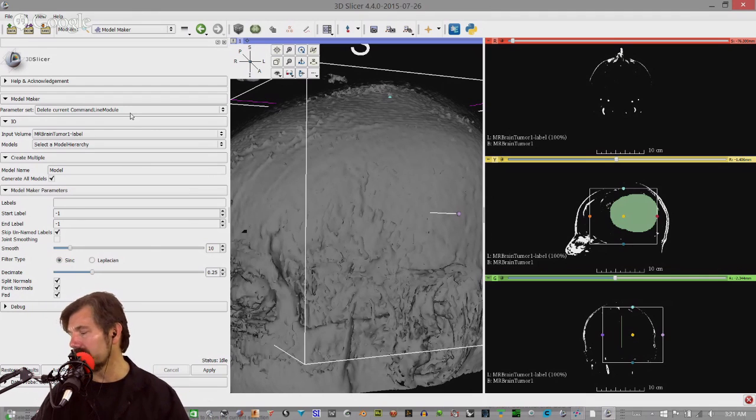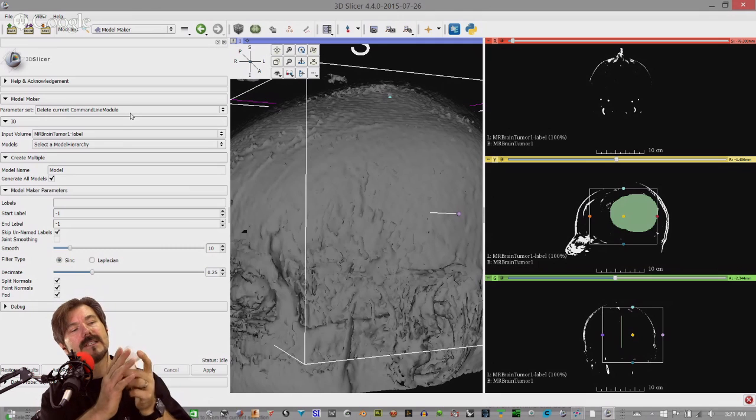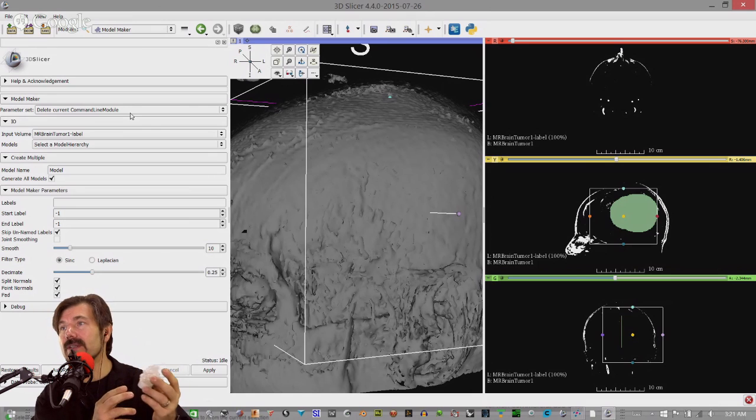For instance, the skull here, I can't remember, it has like 3 million faces, so it's pretty hefty, but it also gives me a nice smooth curve. So that's the possibilities. And what I have found with 3D printing, unlike in the visual world, where you can use software algorithms to create this curve or smoothing, you don't have that flexibility with the printers. So you really have to create the raw faces in order to provide the smoothing.